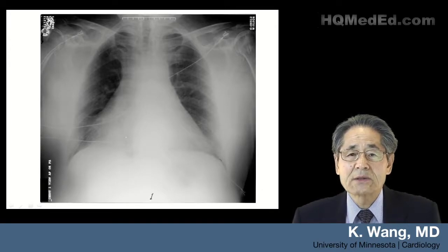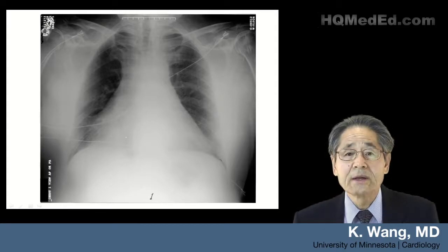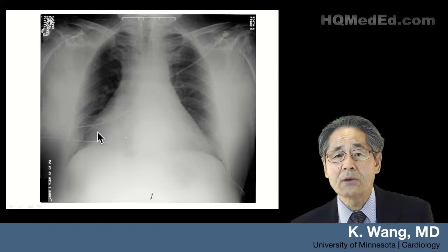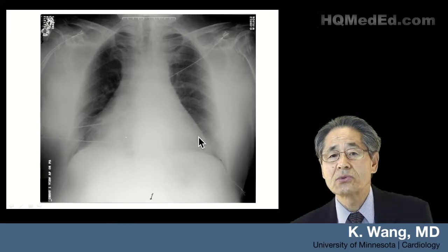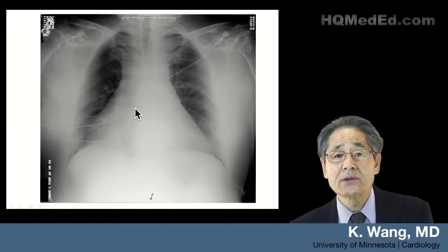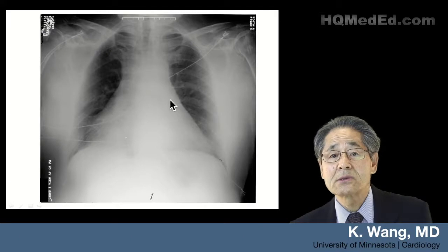At a first glance, one would say, wow, such a marked cardiomegaly. But is it really? Ordinarily, the cardiac silhouette should come in, not splaying out. On this side too, it should come in rather than splaying out. And besides, if you look carefully, there's a double density here. Actually, the heart is this, and this is all something else.